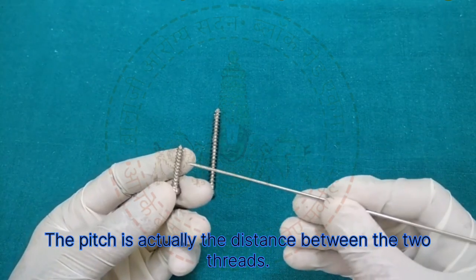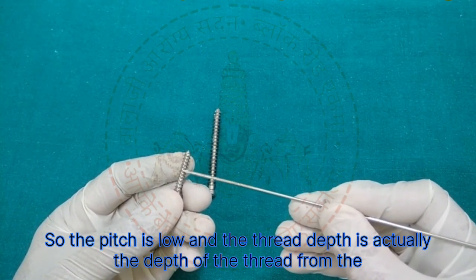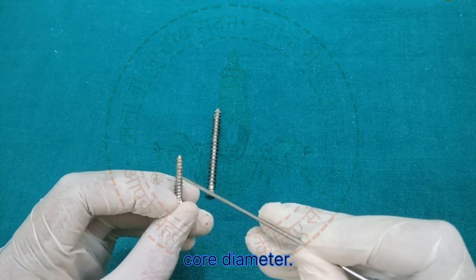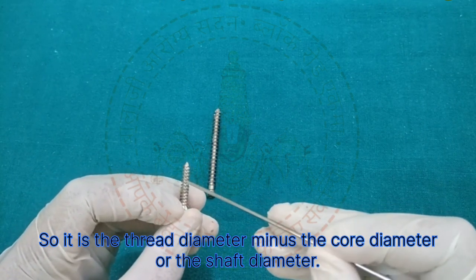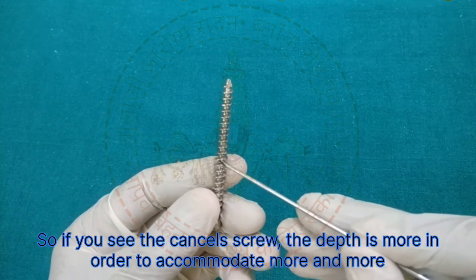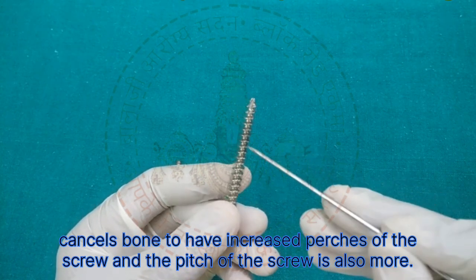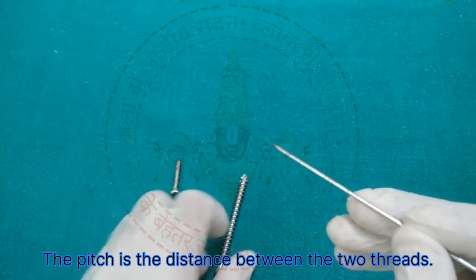So if you see carefully, this is the cortical screw. The pitch is actually the distance between the two threads. So the pitch is low, and the thread depth is the depth of the thread from the core diameter, so it is the thread diameter minus the core diameter or the shaft diameter. If you see the cancellous screw, the depth is more in order to accommodate more and more cancellous bone to have an increased purchase of the screw, and the pitch of the screw is also more.